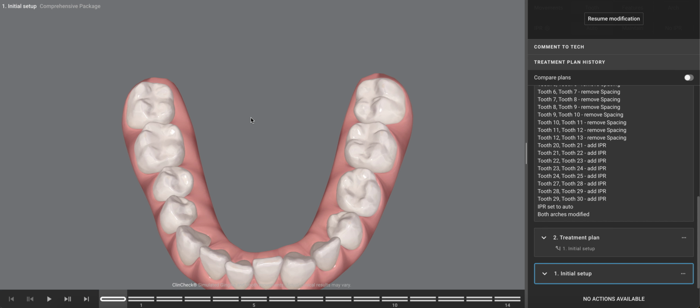With that said, analyze your patient, and if they're at higher risk for airway compromise, then maybe we don't do IPR. But my point here is class 1 and 2, I'm going to try my best to not use IPR where possible. Class 3s, I'm going to be more open to the concept. In this case, I think IPR is a wonderful choice. And we'll get to that in a moment.